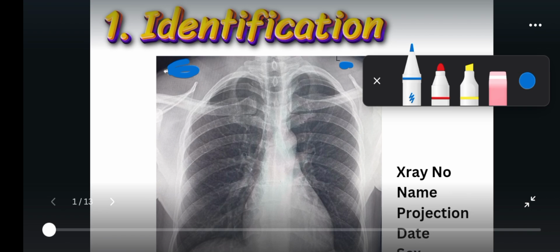But in some instances, in analog setting, the actinic marker they use to place the identification may not come out clearly, so they may still need to write those identification clearer along any free edge that will not obscure the image itself, so they can still write the identification along this line.